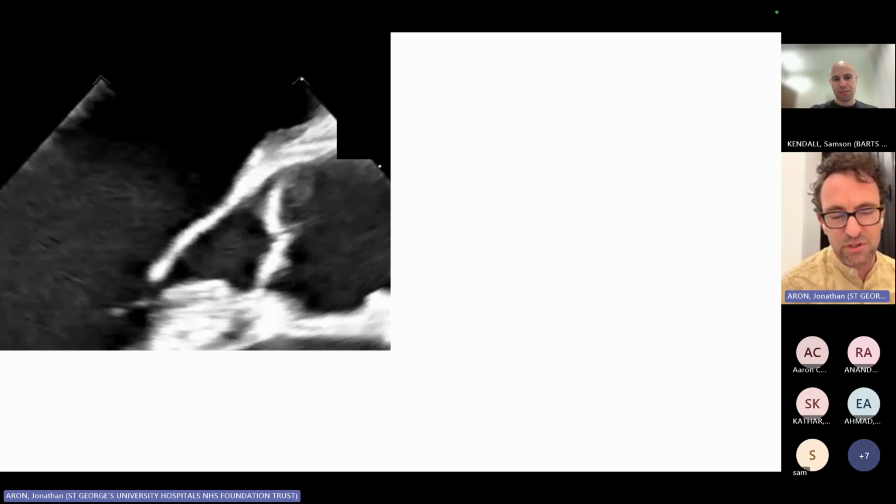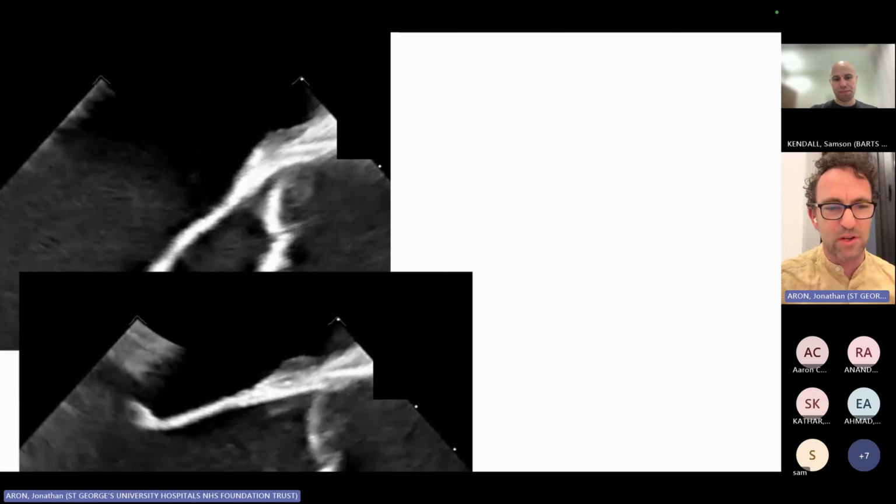This is, of course, diastole. So the mitral valve is open. Now, you would say, oh, this anterior leaflet of the mitral valve is completely obstructing the left ventricular outflow tract. But the left ventricular outflow tract in this part of the cardiac cycle is not being used. There is no flow out of the heart. So all flow is from the left atrium into the left ventricle during diastole. All looks great. Thank you very much.